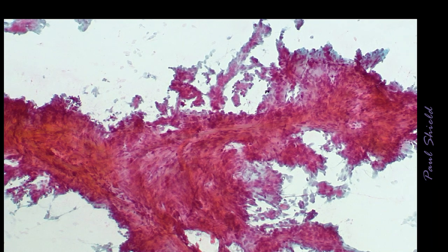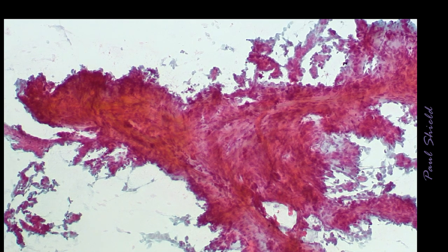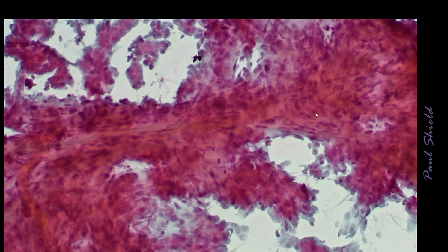These are the highest cellularity specimens that you'll see, and they have large tissue fragments, often like this. You can often see that macroscopically on the slide. And notice how this has this vessel running down through here, and you can see like a stromal core in the middle of it. Just on high power you can see it going through there. See the elongate endothelial cells that line it.